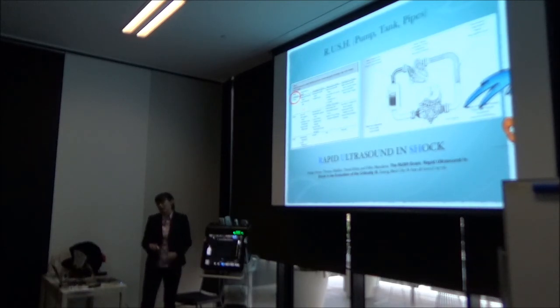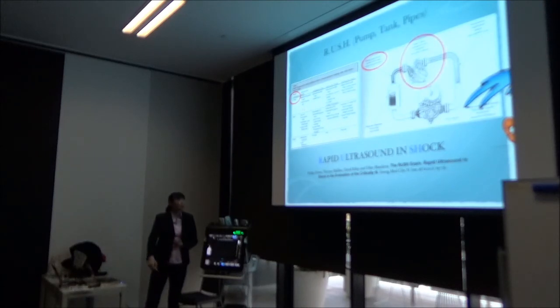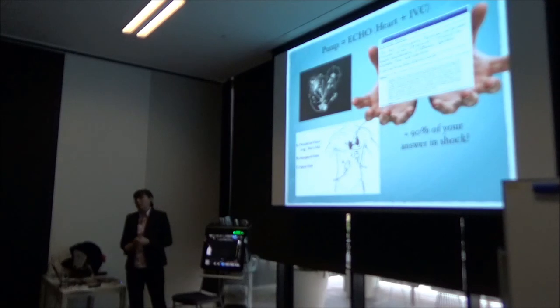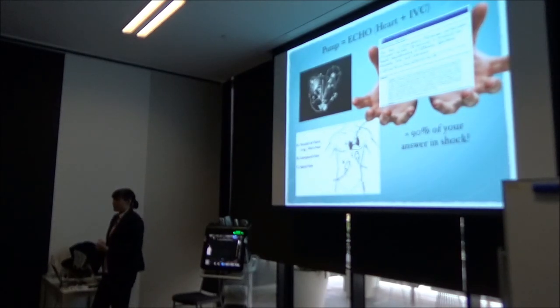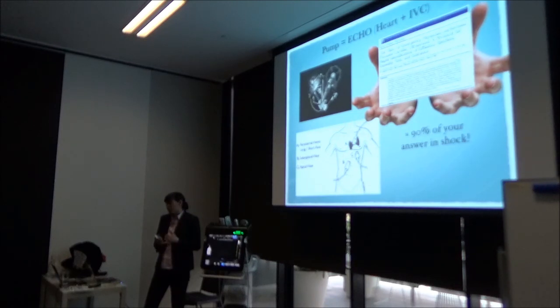First, we're going to start with the pump, and that's pretty self-explanatory. The pump is the heart. Is it working or is it not working? Arun just gave you a really nice recap of the views. So once we have those views, he talked about ejection.